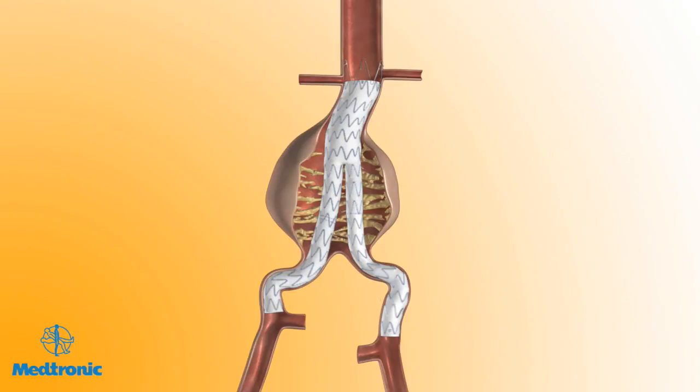If other stent graft components are needed to complete a procedure, please follow the deployment steps for the Endurant aortic delivery system for aortic extension, abdominal tube, and AUI components, and deployment steps for the Endurant iliac delivery system for the iliac extension component.